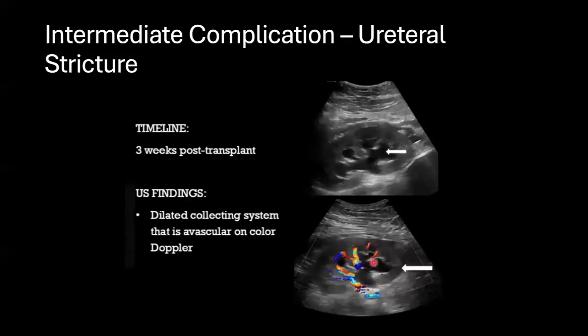And you can see that this area is, of course, important that we put a color image on these areas. You don't want a radiologist to miss a pseudoaneurysm here and call it a dilated system as well.